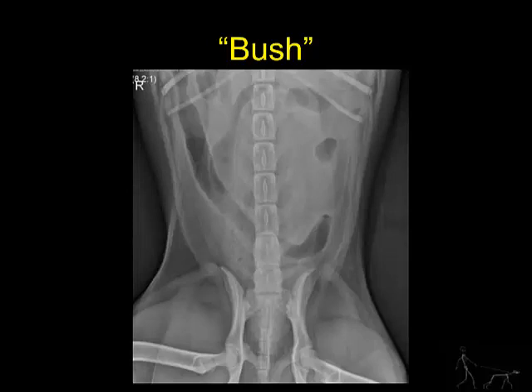There is also a lack of feces within the colon, which typically lies to the left of midline. Close inspection of this region of the colon to the right of midline shows either an abnormal opacity within a small bowel loop or possibly feces. However, again, this is on the wrong side of the animal.